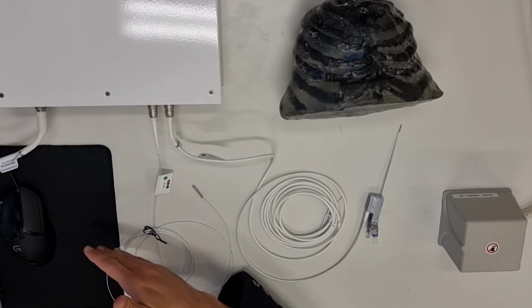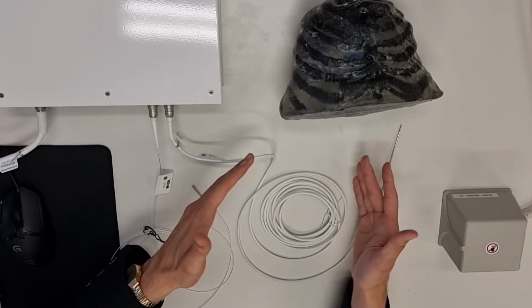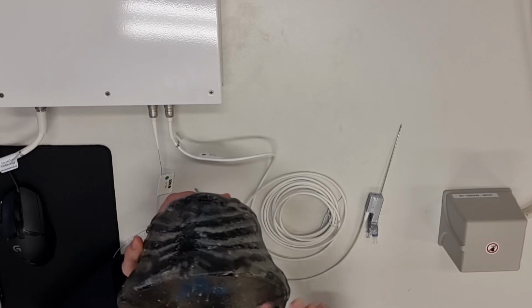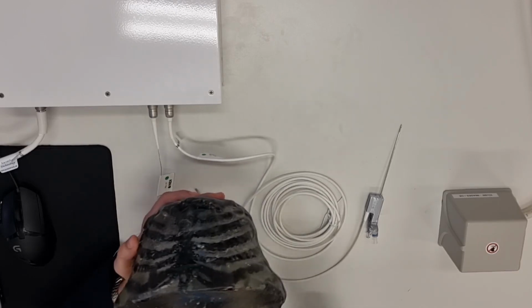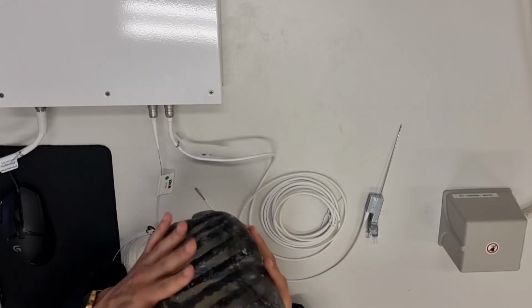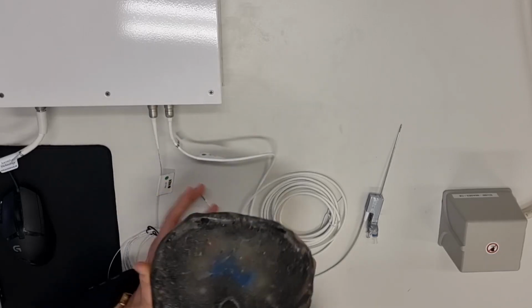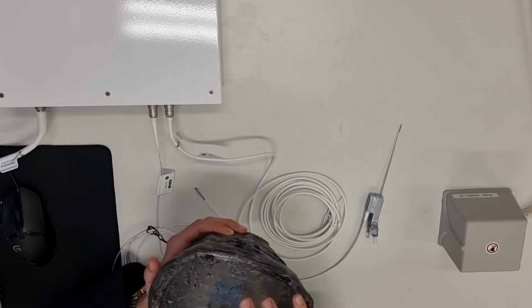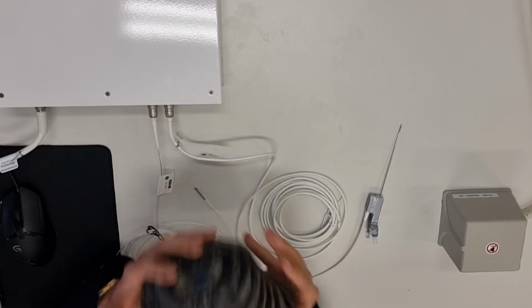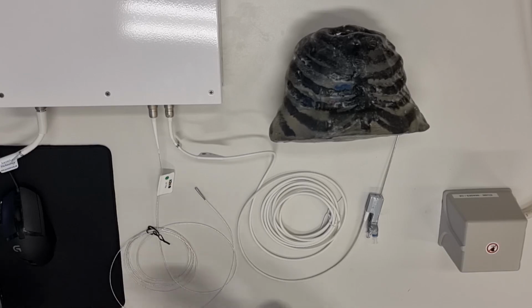CryoTrack, which is an extension of 3D Slicer, and of course our model of a patient here. The model of a patient is called a phantom. Its matrix is made of agar-agar gel, and it contains here in dark and black a bone structure which is flexible in order to be able to simulate breathing. Inside we have in blue a risk structure which is a trachea, and we have small colored dots which are targets. This whole model has been scanned. We have it in 3D on our computer.